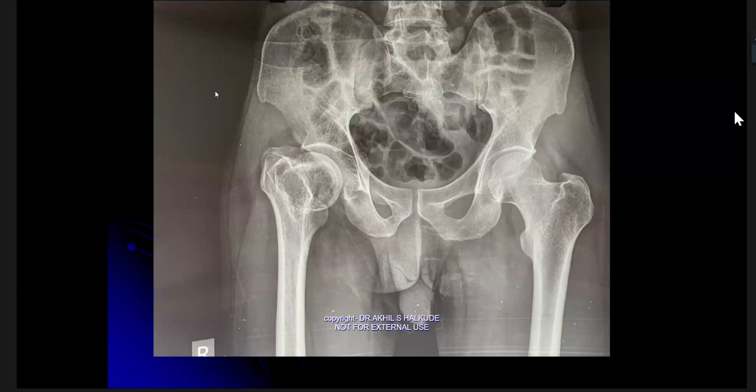Okay, is it possible that osteopenia will be limited to one location and the rest of the bones other than that, and pelvic bones will be normal? Is it possible that a single area has osteopenia and the others are completely normal? If yes, then what does it imply? So yes, in cases of avascular necrosis. Okay, very good. But does avascular necrosis occur in the intertrochanteric region? No sir, head region. Very good. It is a subchondral process. It should be restricted to this area. Here, the subchondral bone looks fine.